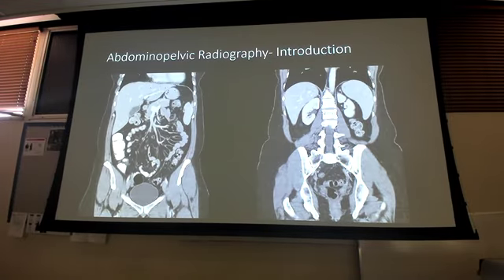Here's your coronals and just your coronals right now, right? So now we got our spleen, we got our liver, we got kidney. Can't see that one there. We got large intestine, we got small intestine, right? What's that guy right there? Let's circle that again. That guy.